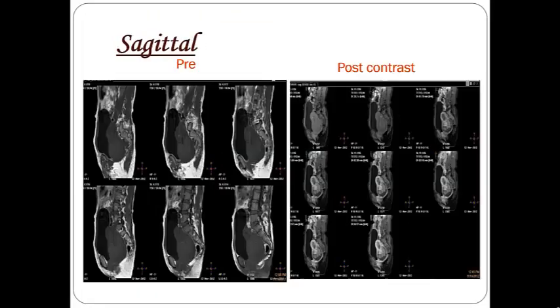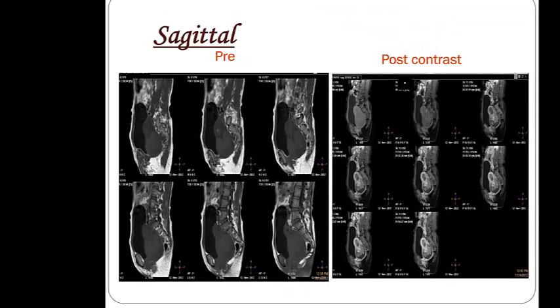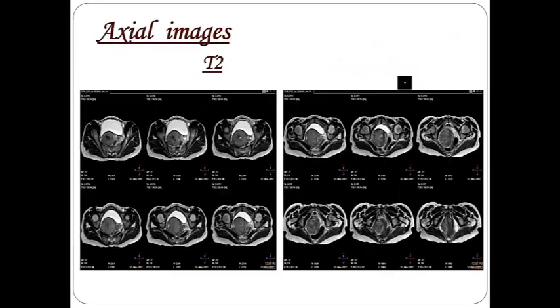This is the post-contrast. As cervical carcinoma, the picture differs from the case of the polyp. Here it is a growth of the cervix engulfing most of the cervical wall, and there is ballooning of the rest of the cervix. I think there is a sort of cervical stenosis at the external os causing this distended fluid. And then we came to the staging.